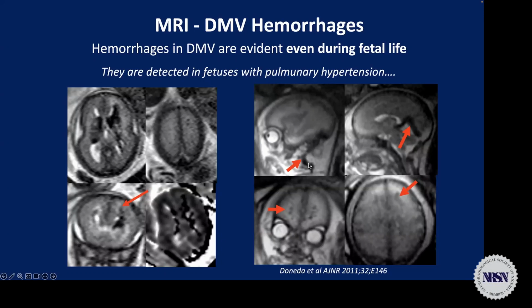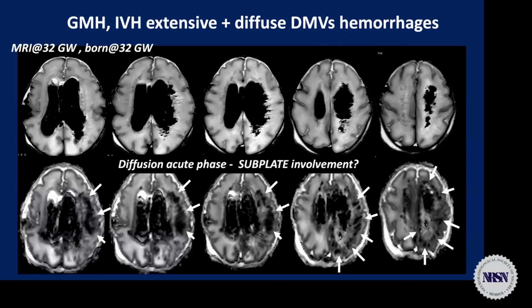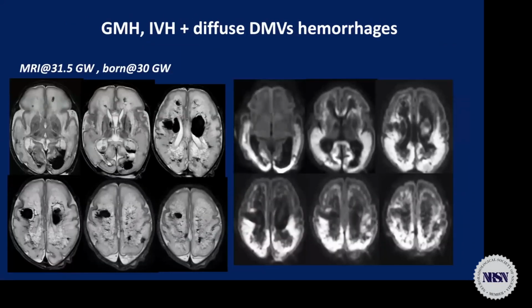Look here, how dilated is the jugular vein, how dilated is the rectus sinus, the vein of Galen here, and the venous compartment is very fragile in the preemie. Look here, a dramatic intraventricular hemorrhage with a diffuse parenchymal hemorrhage along the course of medullary veins.